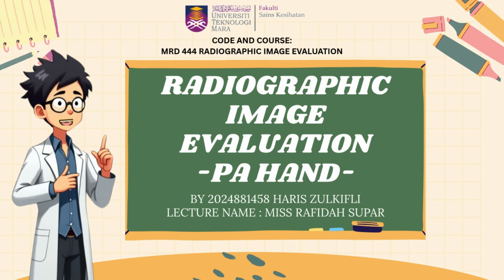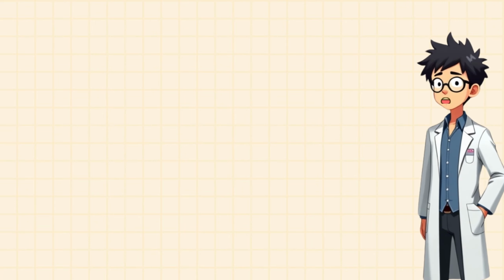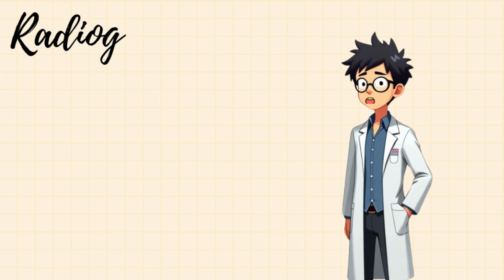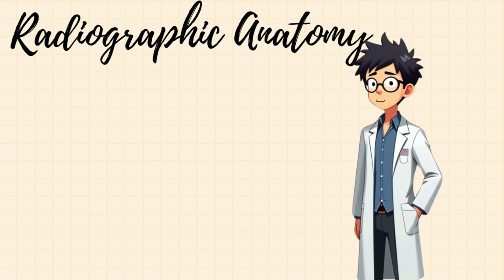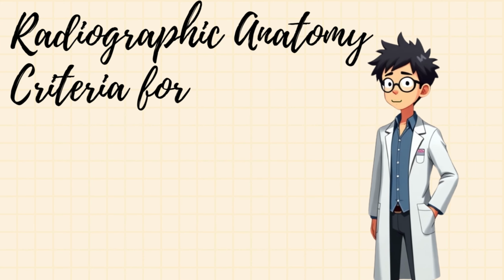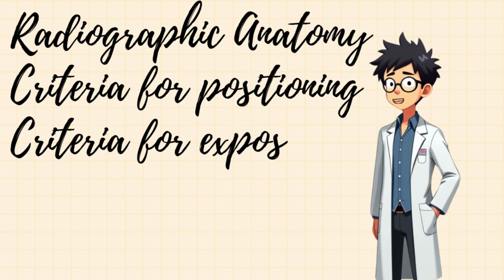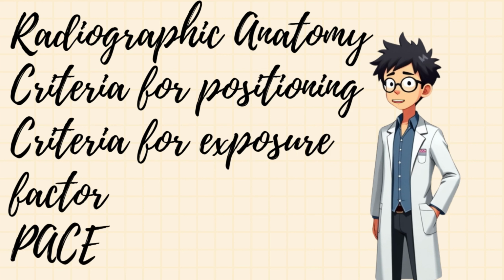Let's begin. This video has been created for the purpose of knowledge sharing. The topics I will cover include the radiographic anatomy of the PA hand, the essential criteria for accurate positioning, and the necessary exposure factors. Finally, I will explain how to evaluate PA hand radiographs using the PACEMAN method.